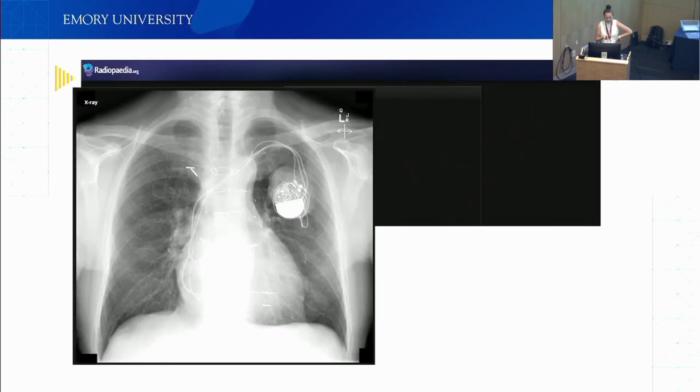So vague chest pain. I will not make this a question, but this is a pacemaker. Luckily, most X-rays don't have enough image quality that we can see the serial number. On CT, we sometimes have to anonymize the serial number of the pacemaker out, but for X-rays, we're good.